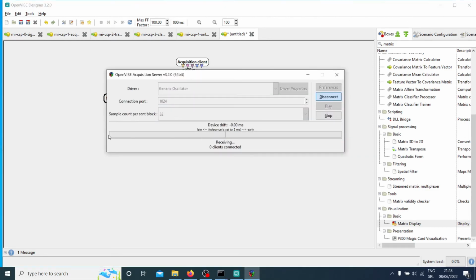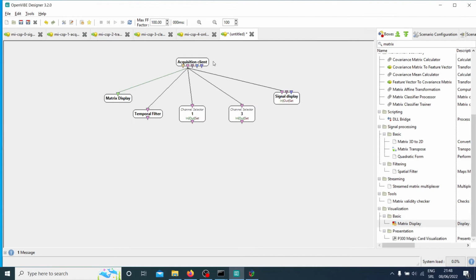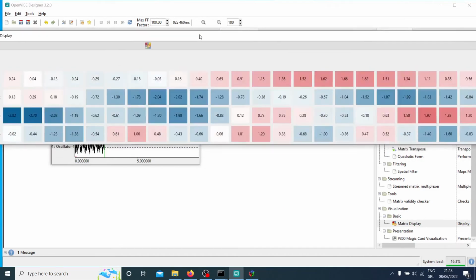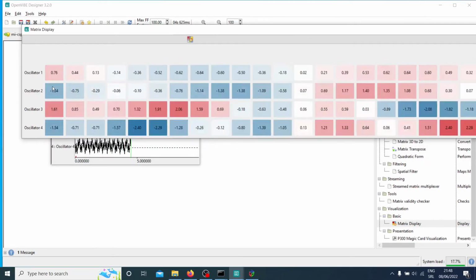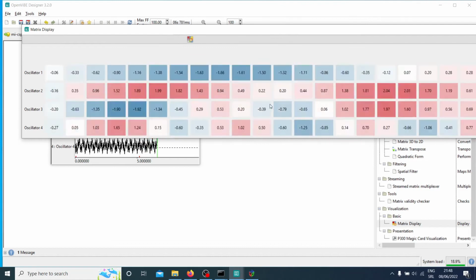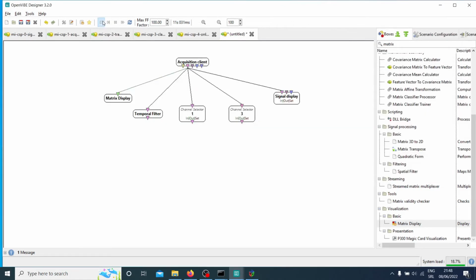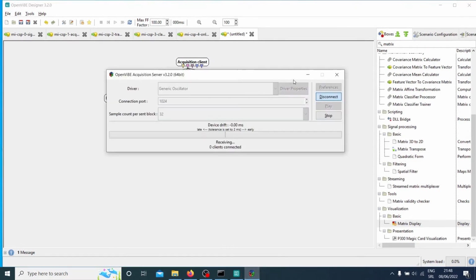It's in 32. So we have 32 values that the designer is receiving. We're receiving 4 channels per 32 values. And each of them is changing with the speed of, what did we say? I think it was 256, but then it's 32 values.